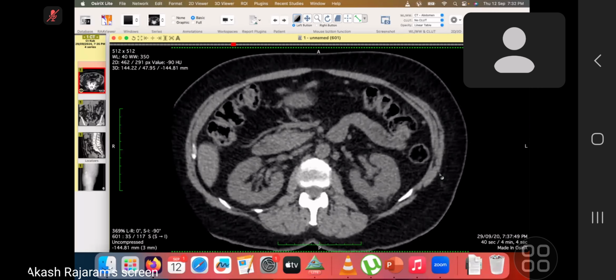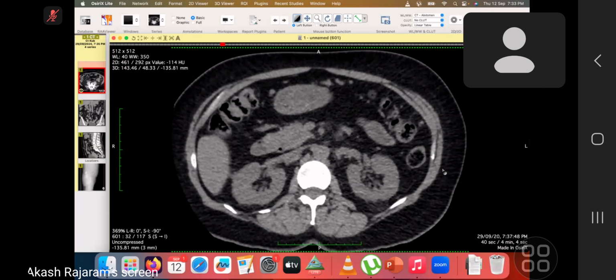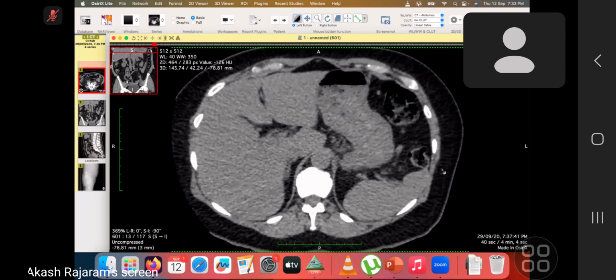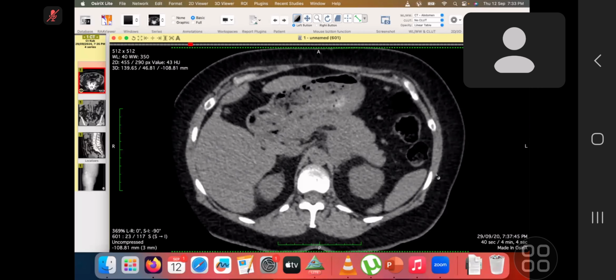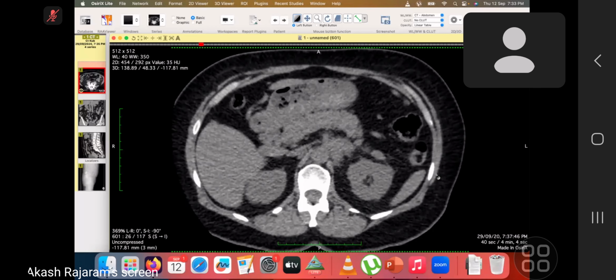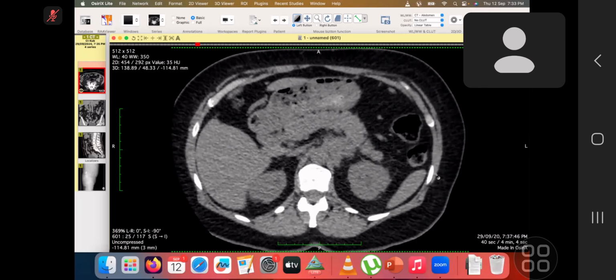It's quite jumpy. In the area just posterior to the pancreatic area and anterior to the left para-aortic area, I could appreciate some soft tissue density with ill-defined margins.